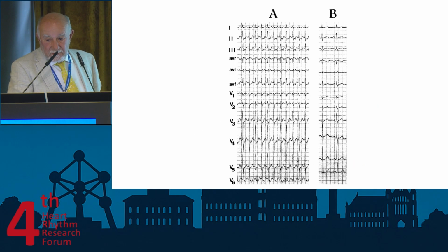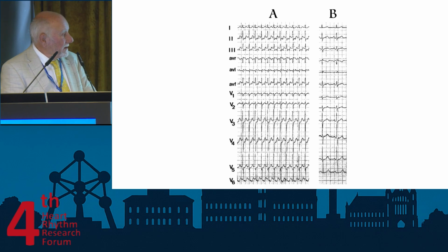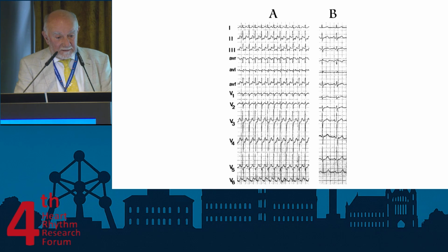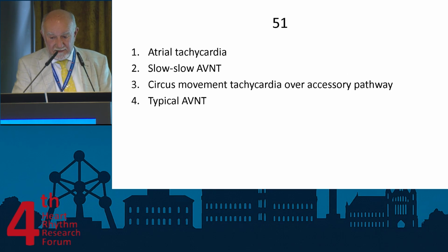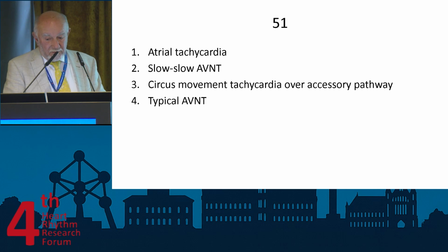Very good. What about this one? I'm going to read the answers for you already. That will be easy. Usually we present that with two screens.